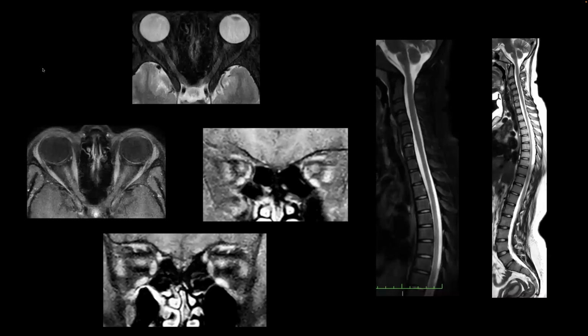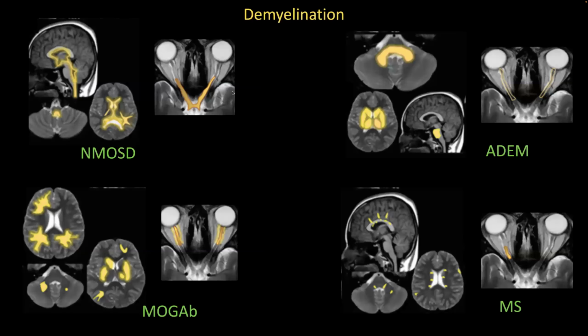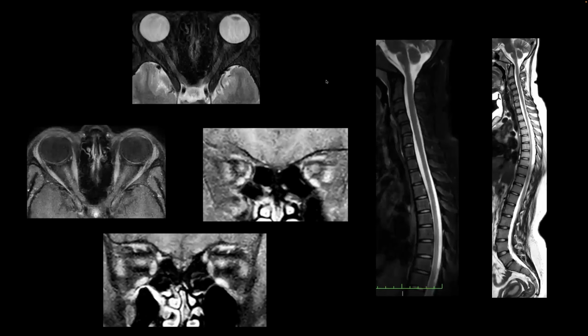I think this is a follow-up side of the optic nerves and the spinal cord later on. Yes, sir. What was the time interval? This was done after 5 months, sir. This was March 23rd. This is all part of the same scan, sir.